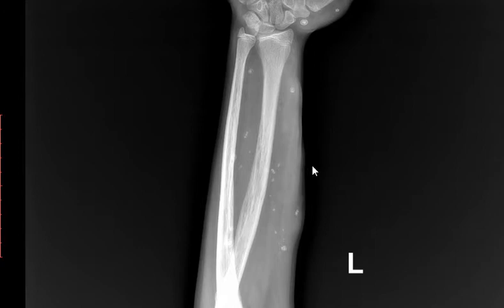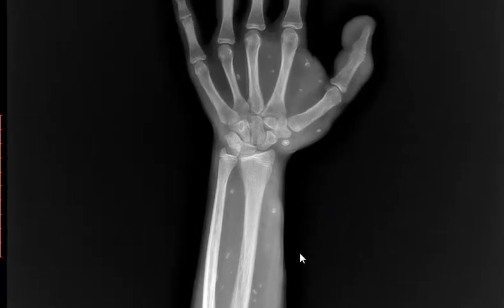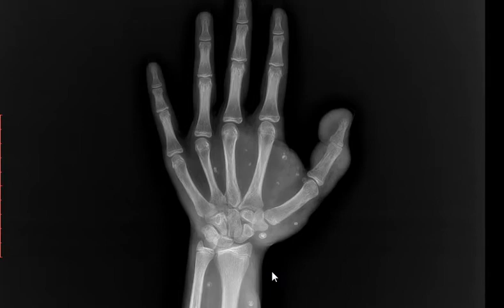Okay. So, what is the case? What is the diagnosis here? One diagnosis. No DDX. What does calcified phleboliths with soft tissue swelling give you? In a diabetic patient, there will be. She's 14 years old. She's not diabetic. Those are calcified arteries, not calcified veins.